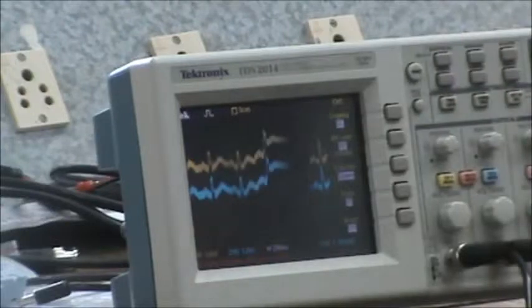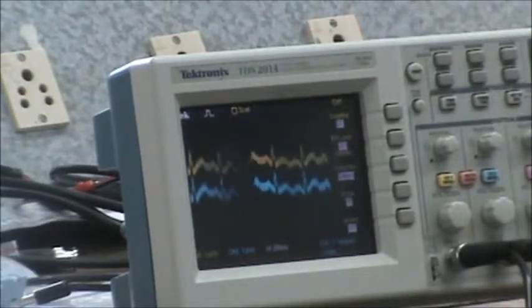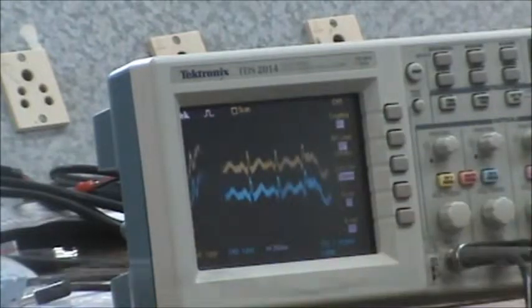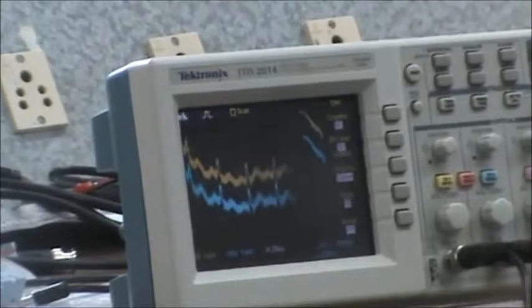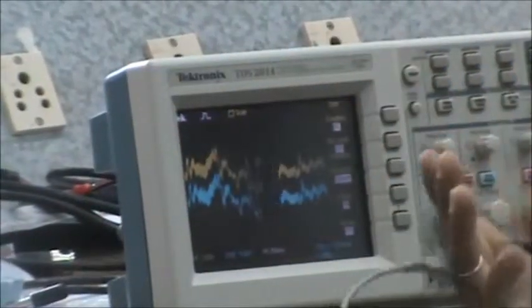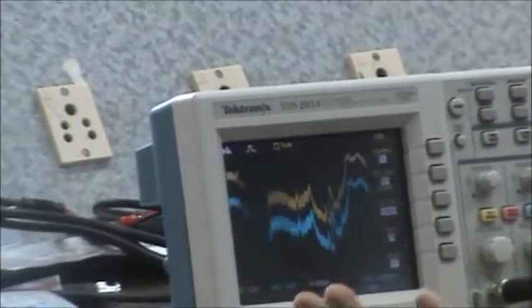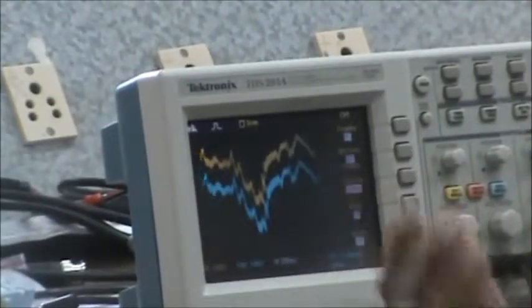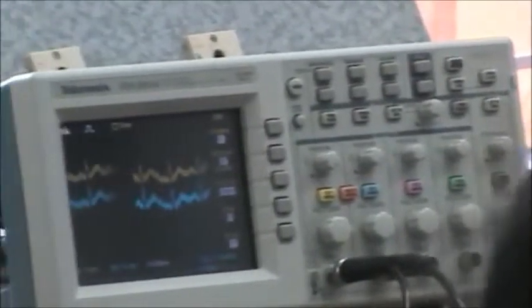You see now, whatever is being transmitted, I am able to get it from the other side. So this side is totally isolated. This side is transmitting, now ECG is in the air, and this side we are picking it up. This can even be picked up on a mobile phone. So this is wireless transmission, using a frequency modulation technique.